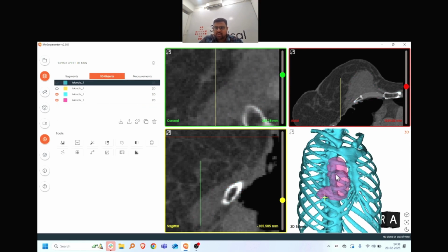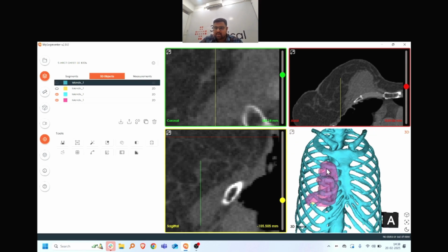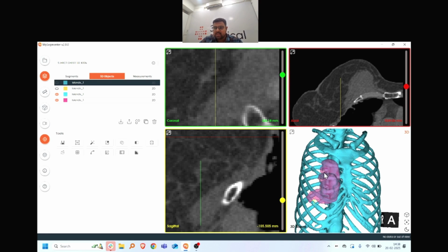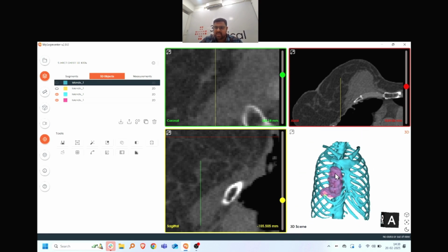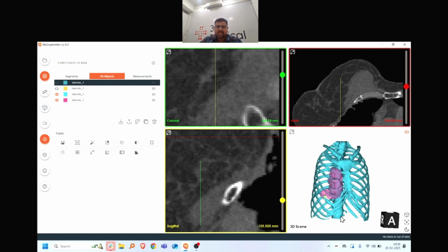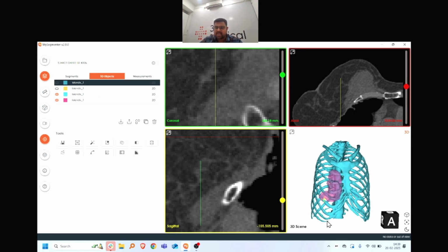So it can be used for surgical planning, and now they can have a better understanding. And on top of it, if required, the design team can develop any implant or cutting guide, or maybe they can simply cut this model in half or reduce it, and have a printable model that can be used for surgery planning and further surgery management and clinical care management.